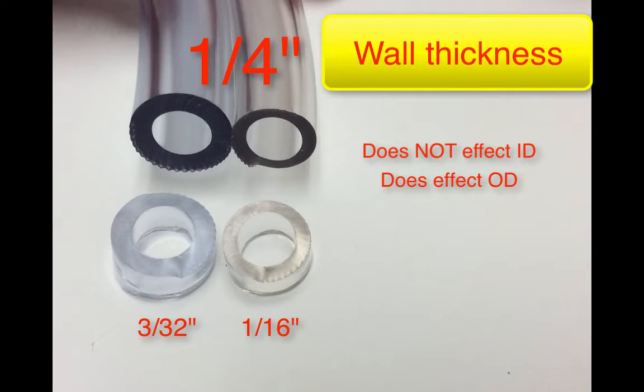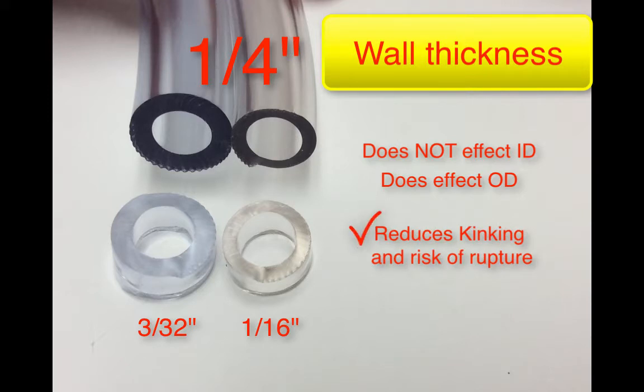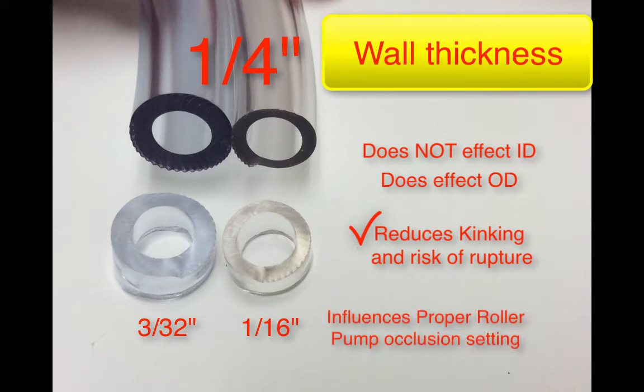Different wall thicknesses give the tubing different characteristics. A thicker wall makes the tubing a little more rigid and reduces accidental kinking of the tubing, and it also reduces the risk of a raceway rupture. However, it's worth noting that the wall thickness of the tubing will influence how you properly set the occlusion on your roller head pumps. To really understand that, we have to look at how a roller head pump uses tubing to generate flow.